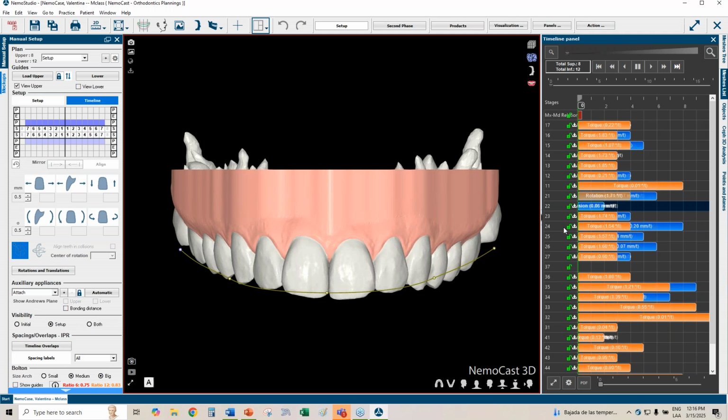The second molar distalizations are not a very difficult movement for me, because I'm going to distalize what I'm expanding. The most difficult situation in this scenario is first creating space so I can correctly perform the IPR and get rid of the rotations of the upper in order to retract it as a full segment, and then do the intrusion.